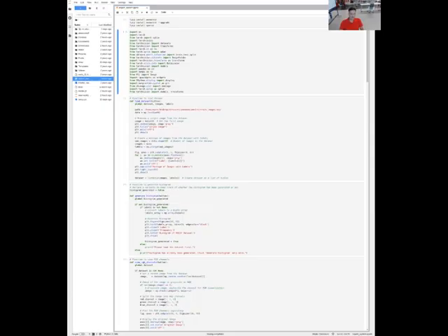I have used the MedMNIST pneumonia chest X-rays dataset for this project. The MedMNIST dataset is a collection of medical image datasets specifically designed for machine learning research and evaluation. It consists of various subsets, each focusing on different medical conditions and imaging modalities. For this project, I am specifically utilizing the pneumonia subset of the MedMNIST dataset.